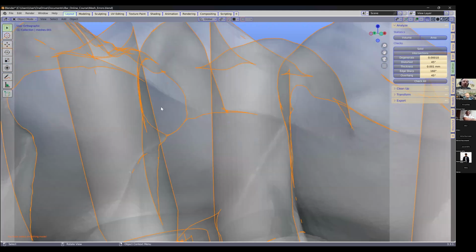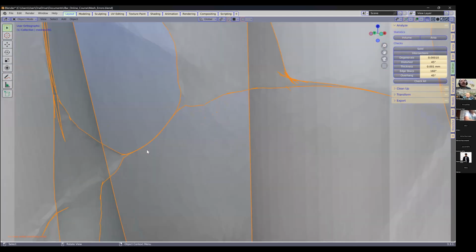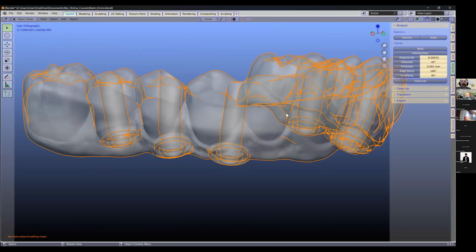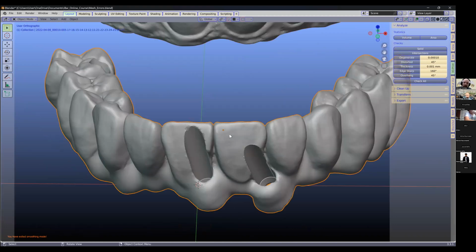Here, for example, the contact, it's got like a string going from this side to the side. We don't want that. So you would then typically just smooth it exactly like we've done in the previous example. Now, this one is, these are problematic, and unfortunately, we've seen many of these.